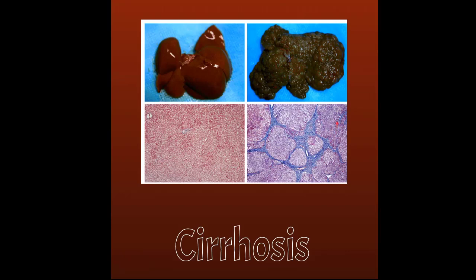And if we look at the microscopic version of it, we can see those fibrotic strands coming through, and you can see how they're separating out these islands. You can see how there's lots of deformity within the tissue. Compare that to the very homogeneous, very uniform appearance of the healthy one. The unhealthy cirrhotic liver just looks really gross, right? So this is a very damaged liver. This is a liver that's not functioning very well.